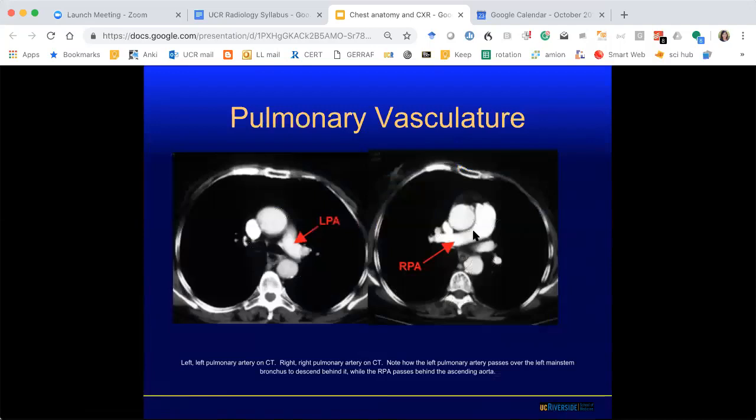So we said earlier that enlarged pulmonary artery, right? Yeah, so an enlarged pulmonary artery suggests pulmonary hypertension. So typically we say 2.9 centimeters. Another sign that we look for is the pulmonary artery should always be smaller than the aorta. So if the pulmonary artery becomes larger than the adjacent aorta, then that's another indirect sign or imaging sign consistent with pulmonary hypertension.